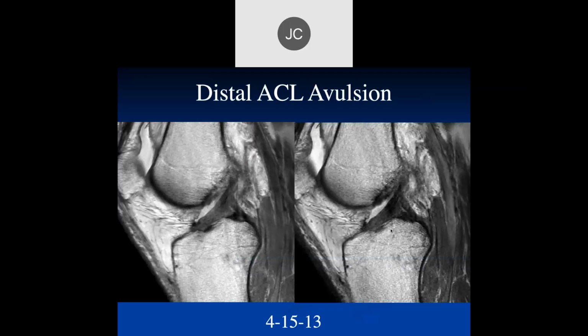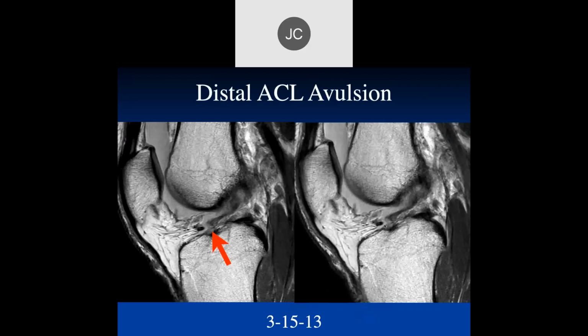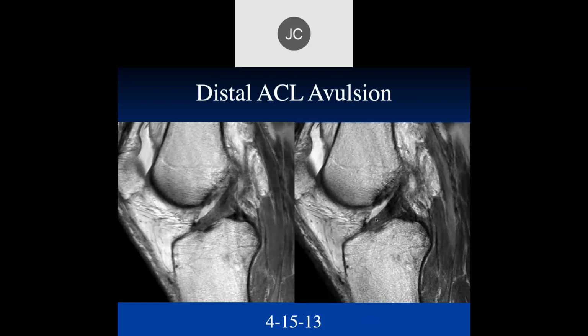So we brought him back a month later. He's an employee at RadNet, so it didn't cost him anything. And what do you think now? I think the ACL looks intact and pretty taut. So it looks like that kind of healed, and it looks reasonably taut. And at this point, he was relatively stable in physical examination and actually was feeling pretty well, though the surgeon wasn't very happy with me.